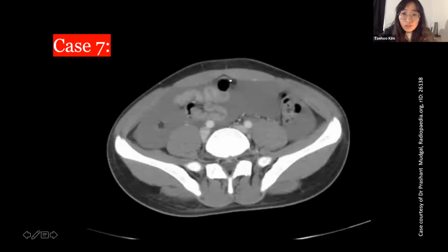So the standard order in which the different image series are typically done. Oh, okay. Looking at the right series for the right pathology. So you mean like which sequence it is, I guess? That was your question, Monica? Yeah. So trauma case, usually it's done with arterial and portovenous phases. And I don't have my PACS open here, but on the left upper hand side, there should be a little label say it's arterial versus portovenous versus delayed. It's always labeled by text, so that should help you.